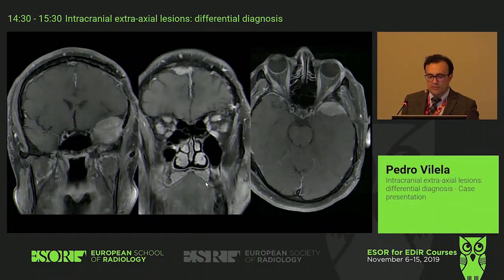Now you give contrast. Now, either I'm having a problem, or I'm seeing a lot of lesions. This is what you were talking about, right? Yes. And this. Yes. What about this? And this. The dural tail sign? No. It's very thick and irregular for a dural tail sign. The lesion is here. Could be meningitis? Or could be two lesions.